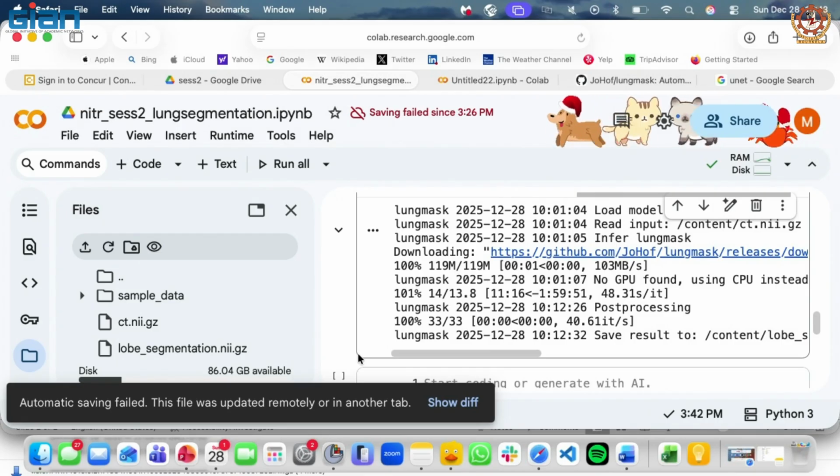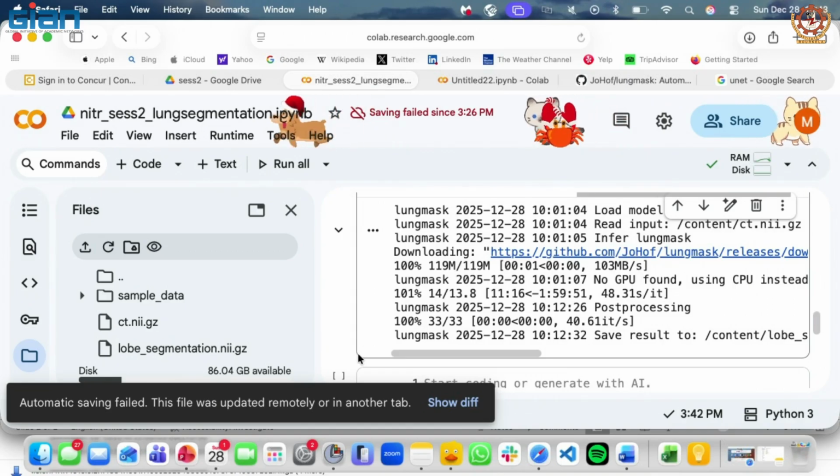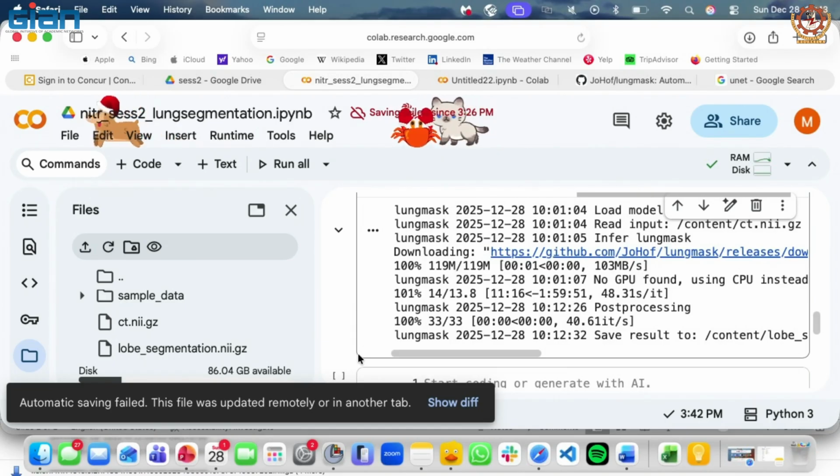And that is why I kept this live thing, because just running my code is easy. Writing with your own hands, even just these two lines, you will learn about how to write even basic code. Even though running this is very easy, let's say you're doing this in your lab and you're not able to figure it out, and after multiple iterations you're like, okay, let's scrap this. I hate deep learning.